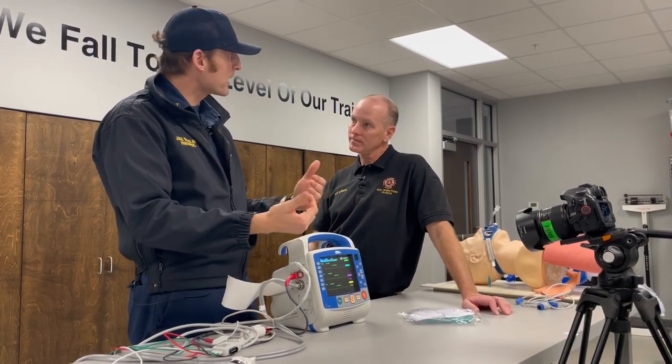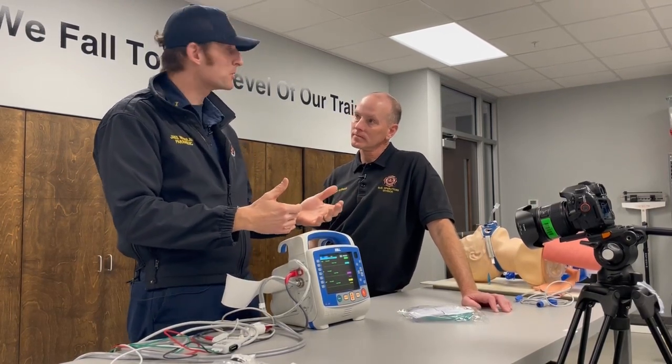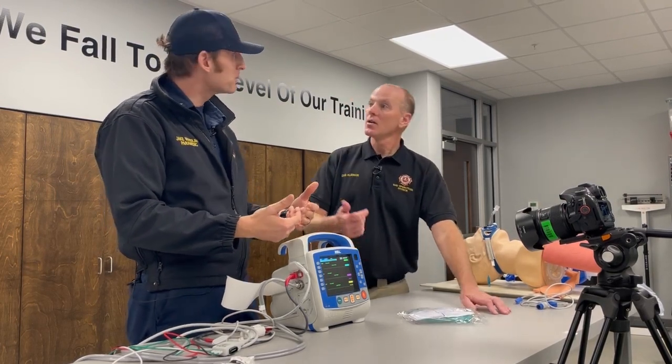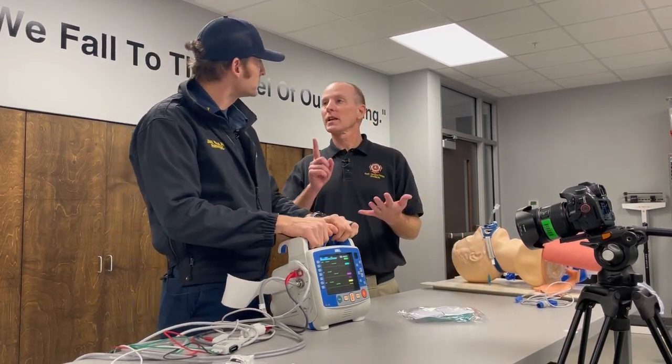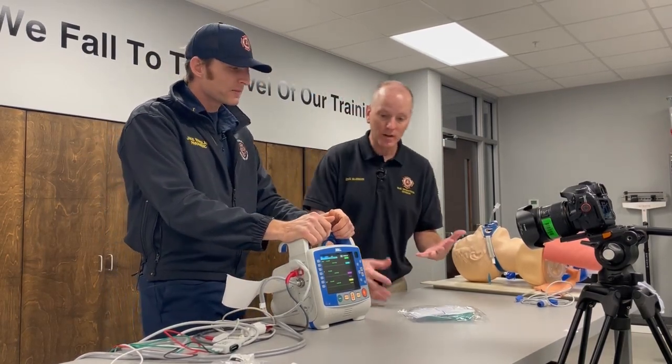So if you're in that 35 to 45, and you're going to have a waveform, we'll show you what the waveform looks like. If you have those two parameters, it tells you, is the patient perfusing? Perfect. Doesn't mean they're not sick, but they're perfusing. Yeah, they're getting enough oxygen into their body, and it's being utilized on a cellular level. Right. More importantly, the brain and the heart.